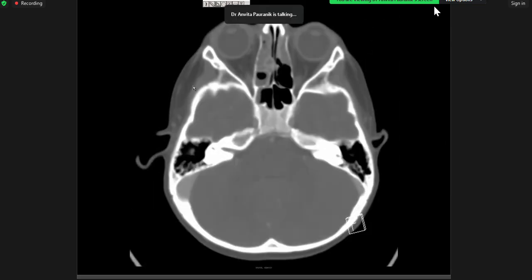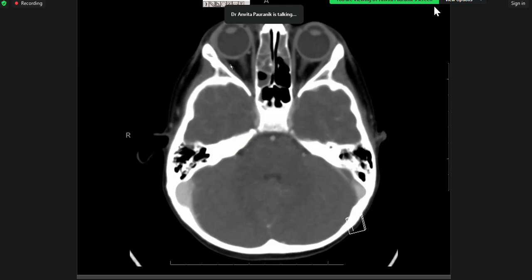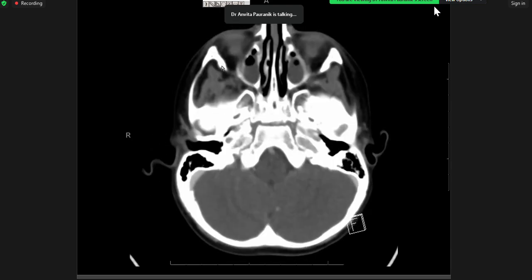Similarly, the moment you see paranasal sinus opacification, look at the degree and the extent. Sometimes it can be quite diffuse, and it can still be fine because the sinuses are not aerated, right? And it can look quite extensive. So we should not be calling sinusitis on CTs all the time. But this case is different.